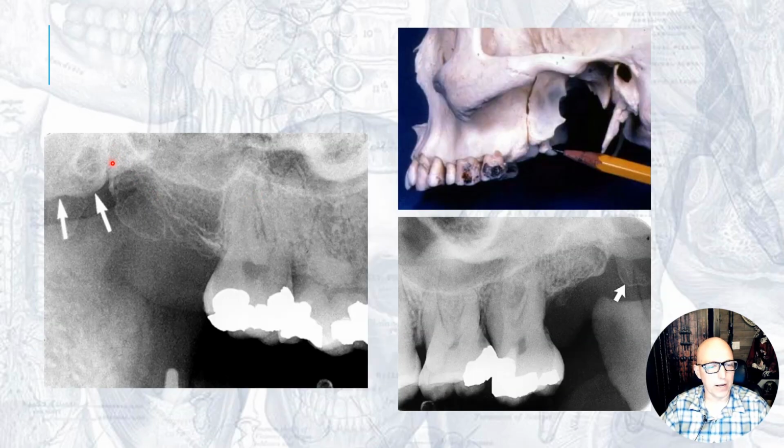All right, what are we pointing at here? Here we have the maxillary tuberosity. We're looking at a right molar. I know that because I see the tuberosity here, so this is posterior. This is going to be more anterior. I see 2 molars here. So what's this plate that extends posterior to the tuberosity? That would be the pterygoid plate.